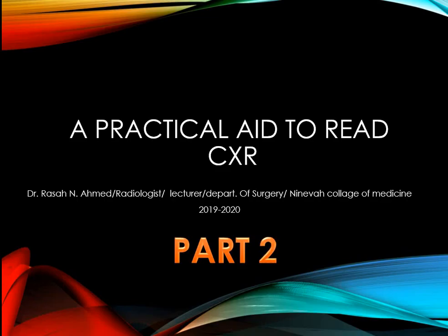Practical aid to read chest X-ray, presented by me, Dr. Rasha Nadim Ahmed, lecturer at the Department of Surgery, Nineveh College of Medicine, and this is part 2 of this.